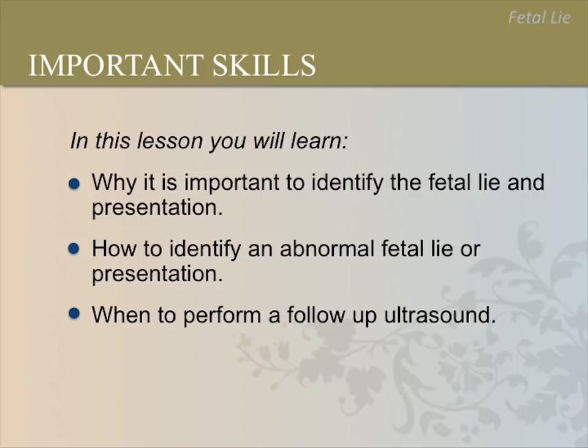In this lesson, you will learn 3 main skills: why it is important to identify the fetal lie and presentation, how to know when it is abnormal, and when to perform a follow-up ultrasound.